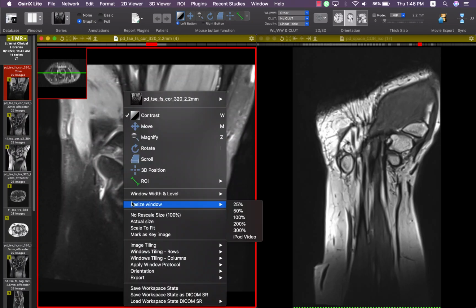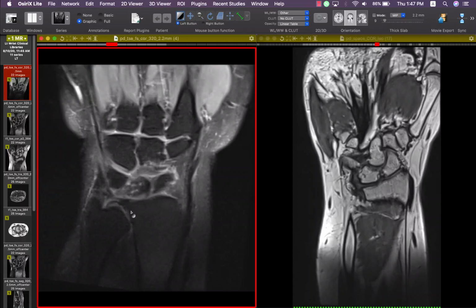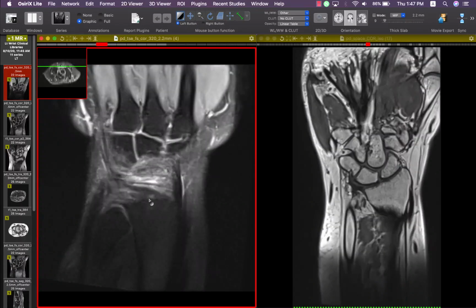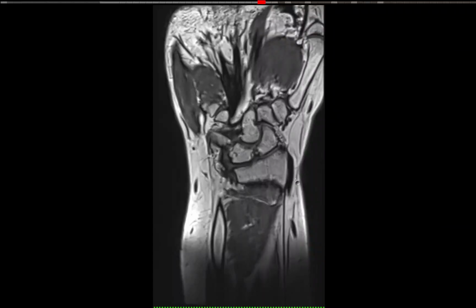So this is the volar radioulnar ligament, and the dorsal component of the radioulnar ligament here, this is the dorsal component. We can see here this is a direct attachment in the radial aspect, but the superior aspect of the dorsal radioulnar ligament is showing ill definition.